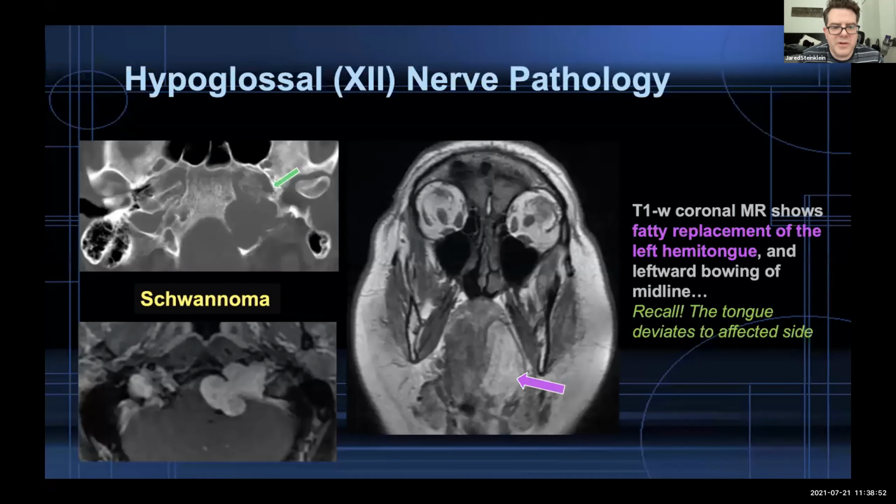Okay, and here's an example, another schwannoma, surprise, surprise. CT nicely shows the scalloping, kind of widening of all the bone there, really focused more deep at the medial skull base. And you can compare, look at the shape. It has a pretty classic dumbbell look to it, or dog bone. It has very rounded lobular, but it kind of squeezes through foramina and mushrooms out in each direction. That's typical of schwannoma. So that's beautifully depicted in that bottom left image.